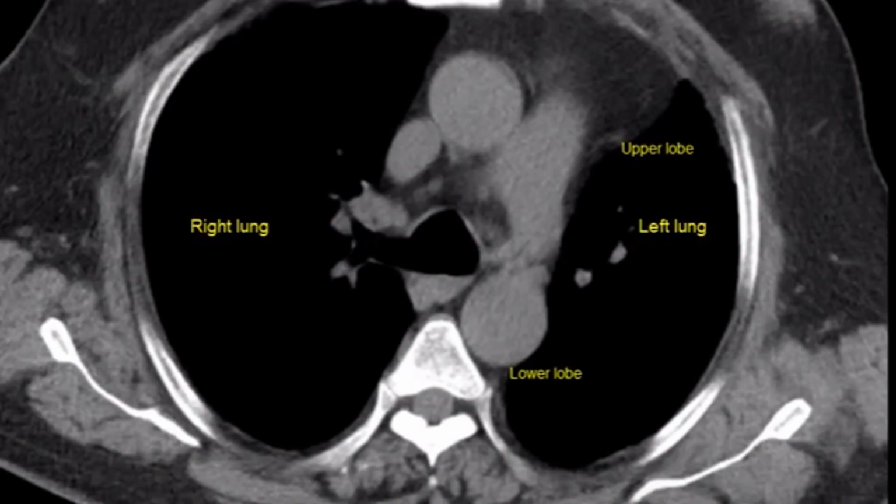Pretty cool. So this is pretty much the same picture, but this is without all the color on it. Here you see the ascending aorta. Here you see the descending aorta. Here you see the pulmonary artery, aka the pulmonary trunk. Here's where you see how this is curved up and down. I'm exaggerating it here, but you see this little spike here.